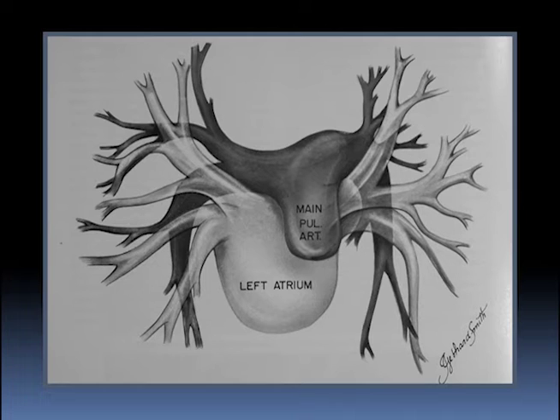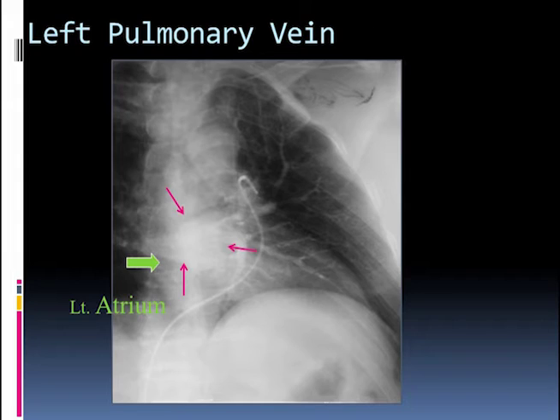There are superior and inferior pulmonary veins on each side, and these you can see on a CT scan very easily. On a chest x-ray, it's a little more difficult, but often we see enlargement of the pulmonary veins, and these are vessels that are straight and that line up with the mediastinum and cross over the hilum as they're going downwards towards the left atrium.